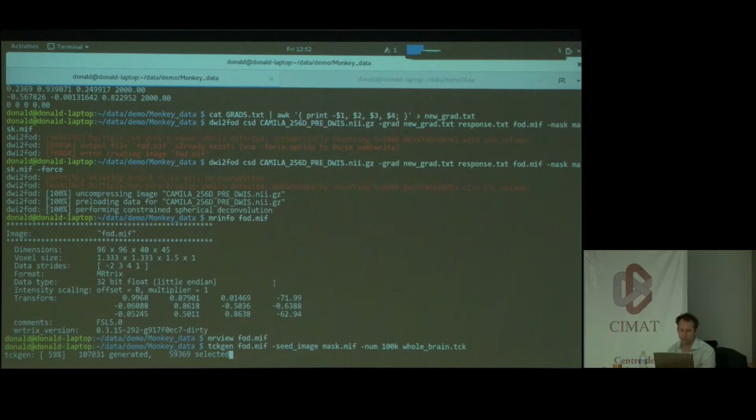I'm not aware of any particular things you can do. Well, the thing is, you've got quite a regular structure in your data. So before processing at all, what you could do is try and apply a correction by figuring out roughly what kind of intensity scaling you get.